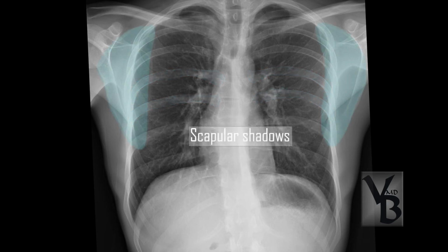A good frontal inspiratory chest radiograph properly positioned would result in the medial margins of scapula on either side occupying very minimal portions of the lung zones. You just need to be conscious about the presence of the scapulae because they can cause overlapping shadows, especially once you start picking up lung pathologies. So two bones overlapping always produces an increased density on the frontal chest projection, and we need to be aware of it so that we do not miscall them as abnormalities on a chest X-ray.